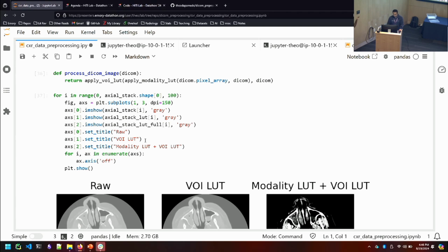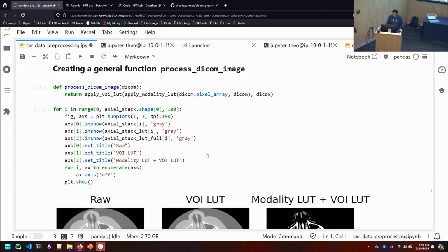So all of this stuff that we just did, I just want to make sure that we zoom out and talk about the big picture, right? What is the function here? The challenge is the bit depth of DICOM, whether it's 12-bit or 16-bit, is more shades of grayscale than human eyes can perceive and more shades of grayscale than a monitor can display, right?